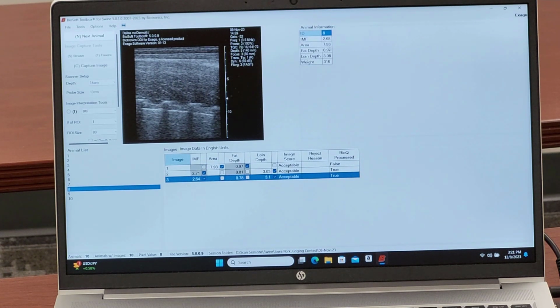So it'll come out at 2.68 if you average these two together. Now I recommend that you take two of these scans on each animal, and if there's a big difference between them, I would recommend that you scan them again and just take out the outlier, because maybe you got some blurred images or something that went into this that need to be taken into account.